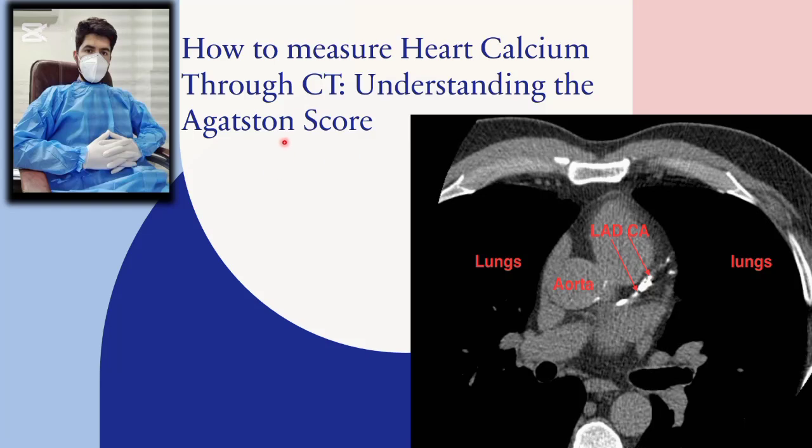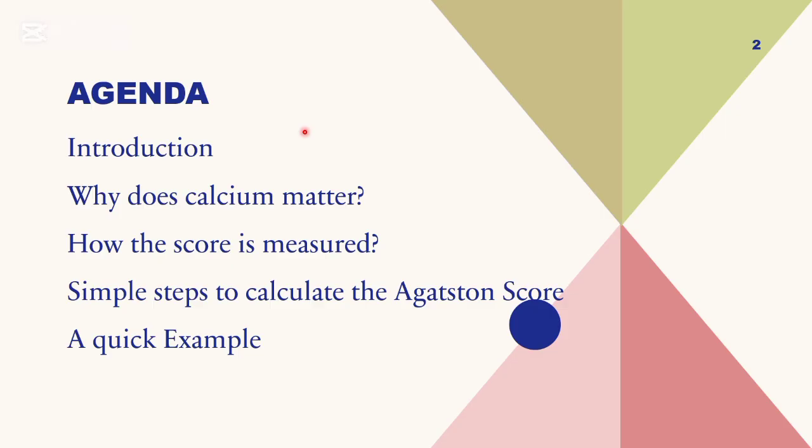Bismillahirrahmanirrahim. Today we will talk about how to measure the heart calcium through computed tomography, the cardiac calcium, and what is the Agatston score and how we will calculate it.